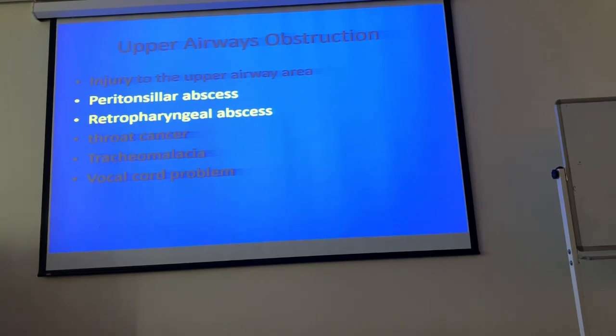The middle lobe bronchus, I've seen many cases of middle lobe bronchomalacia, and the patient is having middle lobe atelectasis. Atelectasis should have a cause, but there was no cause, and finally we found out that it was because the middle lobe bronchus was so soft that it collapsed.